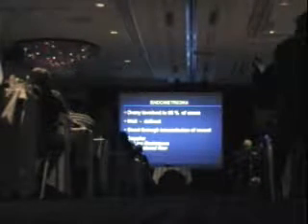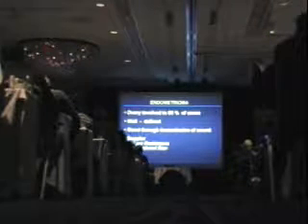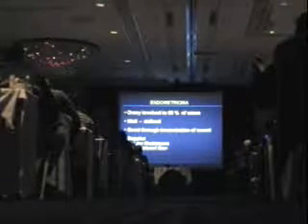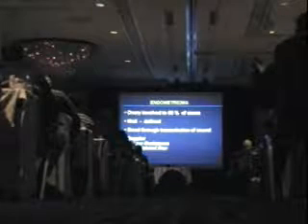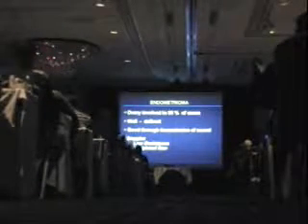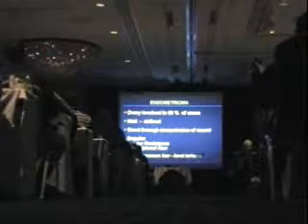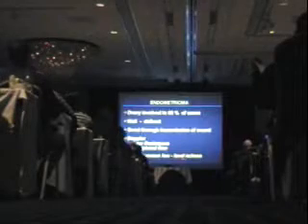So the ovary, most women who have endometriosis, the most common appearance on ultrasound in endometriosis is a normal scan. It's only when you develop an endometrioma, typically within the ovary, that you see these echogenic masses that typically have these homogeneous low-level echoes.